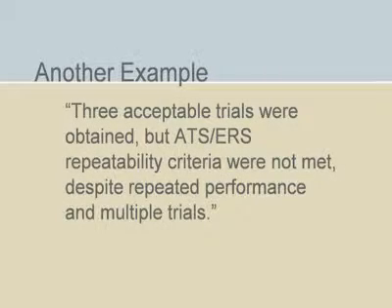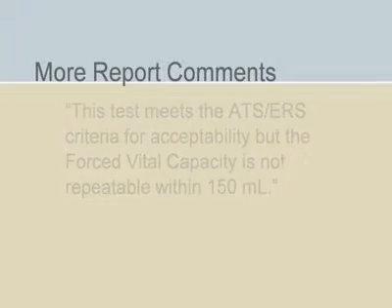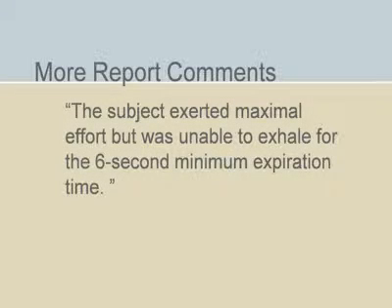Here is another example of a comment, this time being when the data was not repeatable after multiple trials. 3 acceptable trials were obtained, but ATS-ERS repeatability criteria were not met, despite repeated performance in multiple trials. Another good example? This test meets the ATS-ERS criteria for acceptability, but the forced vital capacity is not repeatable within 150 milliliters. Or the subject exerted maximal effort, but was unable to exhale for the 6-second minimum expiration time.